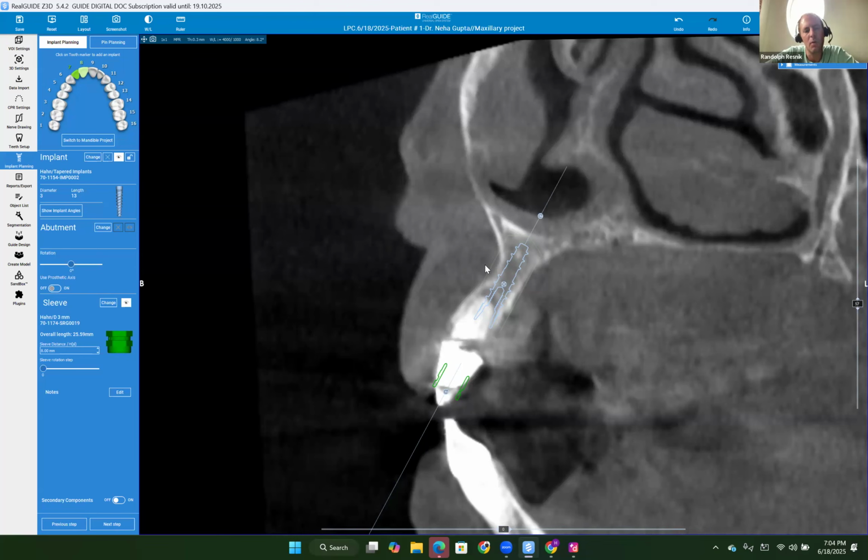Okay. So just looking at number 7 here, it's good that it's a resorbed root. Whenever we're doing immediate implants, we want to engage at least 2 to 4 millimeters of apical bone. So that's not an issue for this case to obtain primary stability. The concern with this site is, one, going to be the periapical radiolucency. When you degranulate that, you're more than likely going to be losing that buccal plate, or it will be very, very thin there.